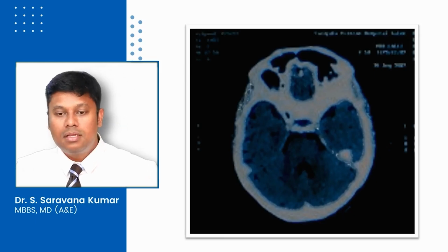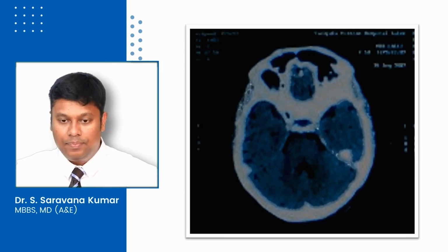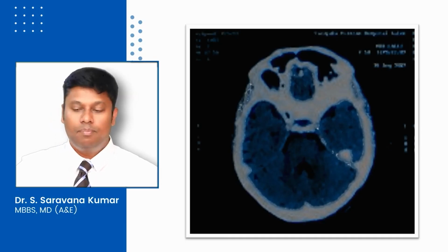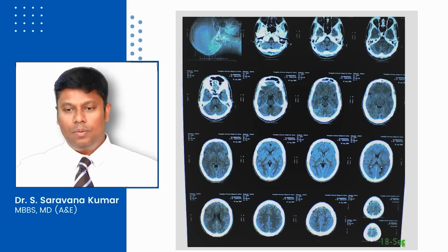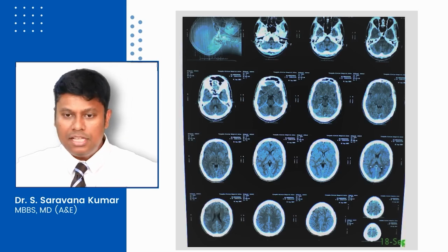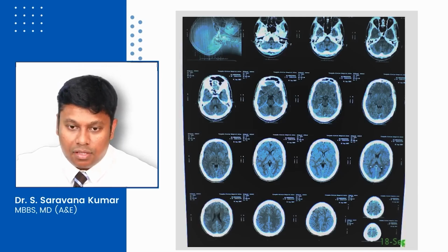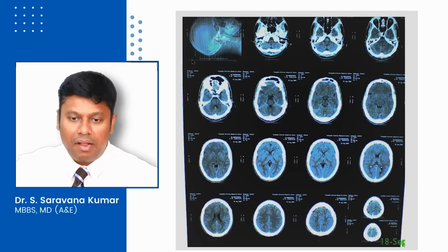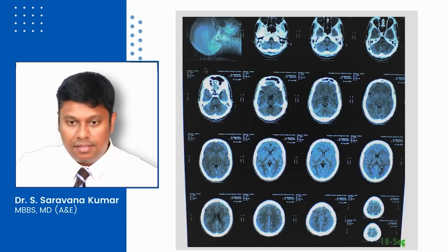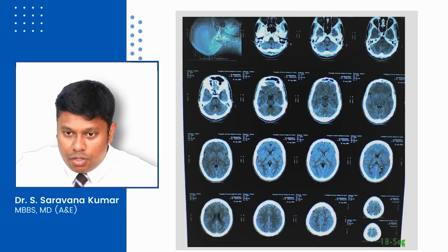I am going to show an enlarged image of the same. As you can see on the screen, this is an image of a CT slice where you can see the middle cerebellar peduncles, the pons, and the cerebellum. So this is an image of a pons. Assuming you get a CT scan like this, I am showing you an entire film. As you can see on the screen, it has the first slice, and this shows the thickness of each of those slices. Just scroll through to see if you are able to identify pons.